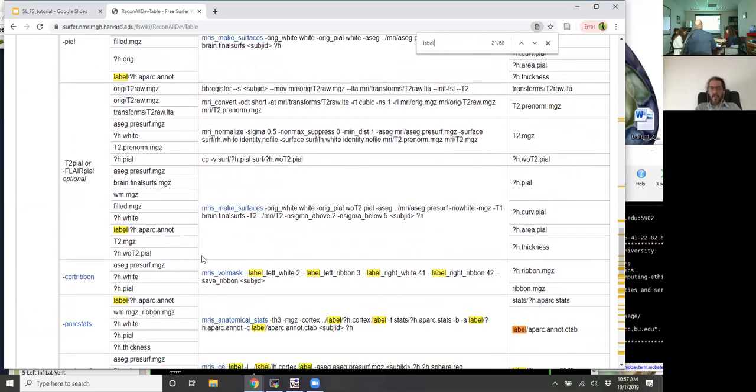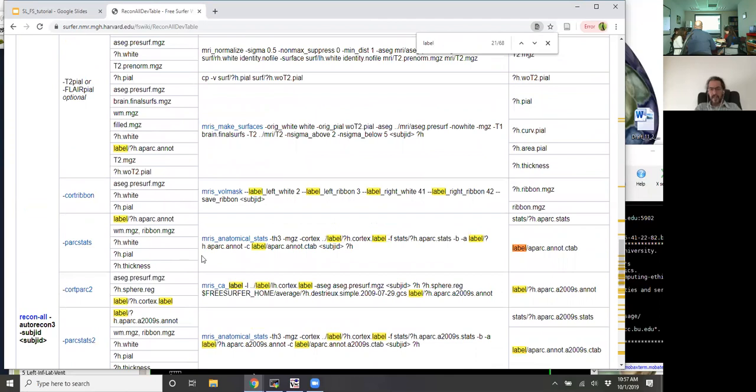One question: the annotation files that this pipeline generates, they are all in the subject space, right? They are not like fsaverage, so they contain the same number of vertices as the original parcellation of the brain in the subject, which is not the default number of vertices in fsaverage. Is that right? Yep, and that's one thing to keep in mind: all those annotation files are in the individual subject space. You can't directly apply them to, say, the fsaverage template or any other frame. There's a specific mapping there.